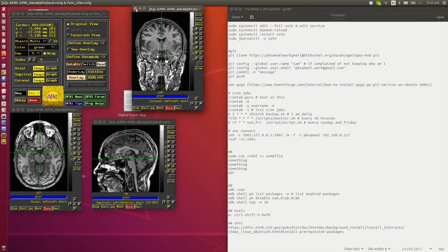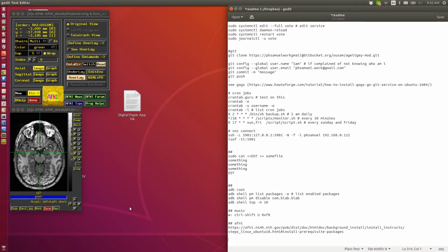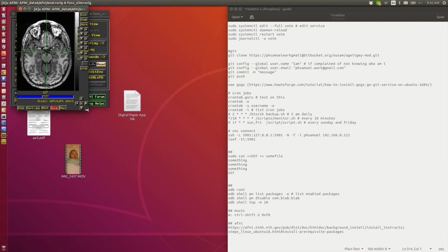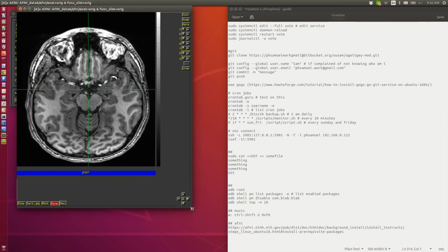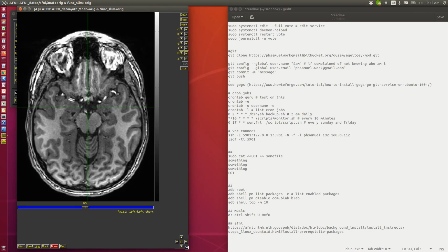You can close the windows using the interface the operating system provides, or I can close it with a button here at the bottom, which is in red. Click on that and it will close. The button is labeled done. In general, buttons that are labeled red are the most active button in a window. So here in the AFNI controller, done. If I press this, it will close the AFNI controller and the program. I'm not going to press that. Well, I'm going to press it. You'll see what happens. It changes to all caps.